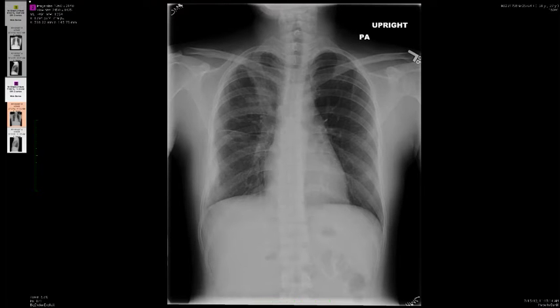So here is a 27-year-old woman who at this time in 2012 presented with fever and night sweats and had a diagnosis of tuberculosis made. So this is acute tuberculosis in the right upper lobe. And you can see that there's maybe some pleural involvement down here, some pleural stripe there that seems to be fat, stuff like that. And she was treated.